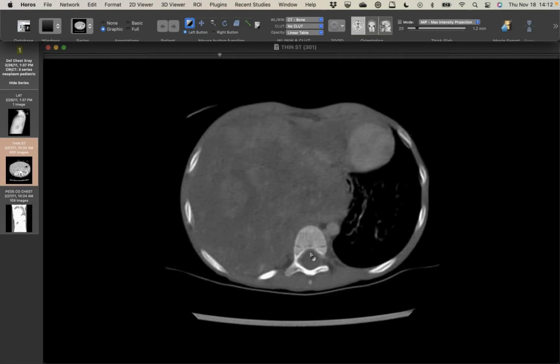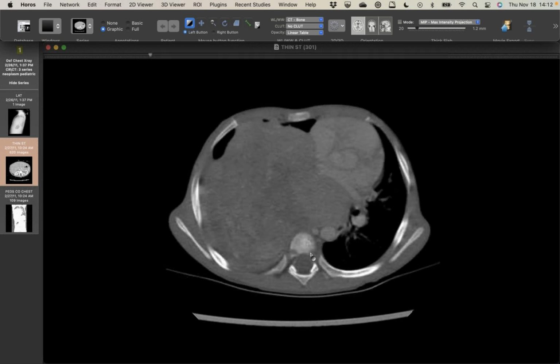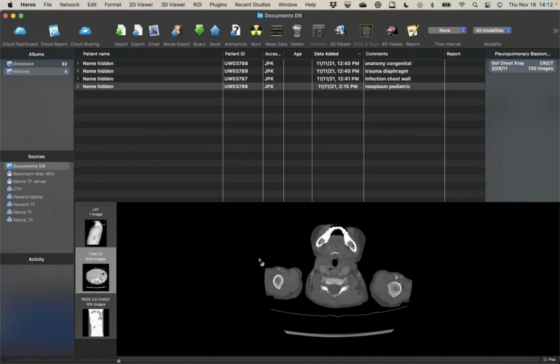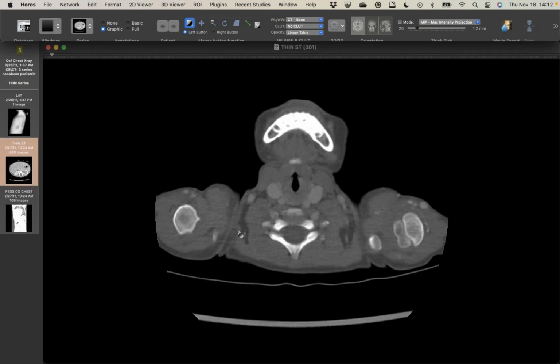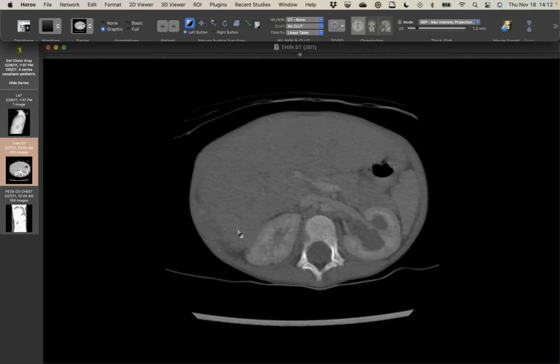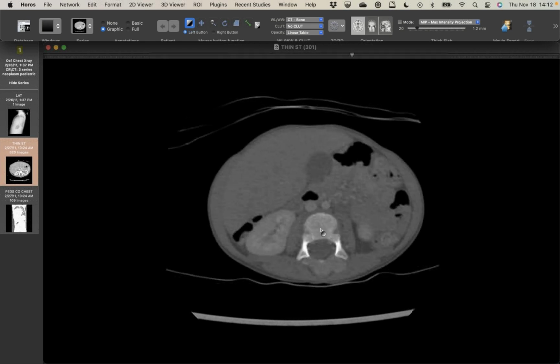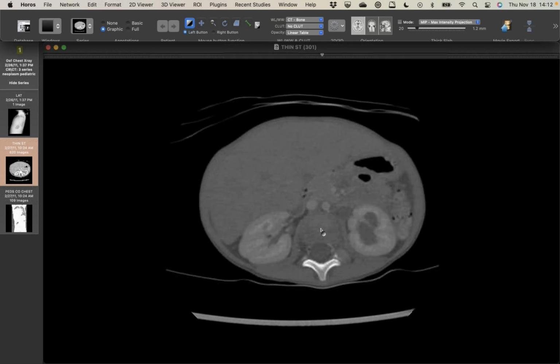But if this were an adult, then I'd start wondering about a sarcoma or a fibrous tumor of the pleura that had transformed into a more aggressive one. But pleuropulmonary blastoma in a child. And Jeff, what was going on with that left kidney? Because I don't know which type, but I know they can be associated with multilocular cystic nephromas. But was that just a little bit of, I think it's just hydronephrosis on both sides. Yeah, I don't know if it was type 3 or what. I just vaguely remember that association.